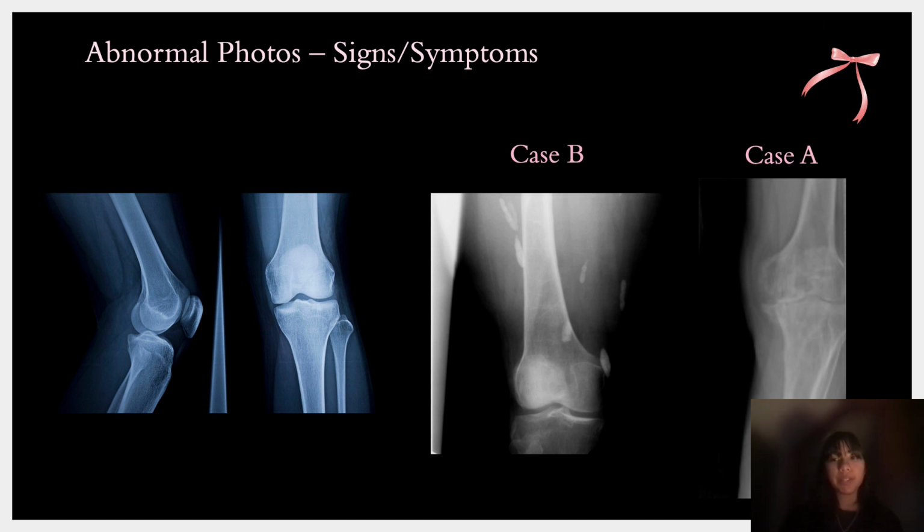So the bone is clearly misshapen compared to the normal one right here. And it also is slightly bow-legged. The case states that the patient has diffuse bone lesions and a thick bone cortex in the fibula, and uneven densities.